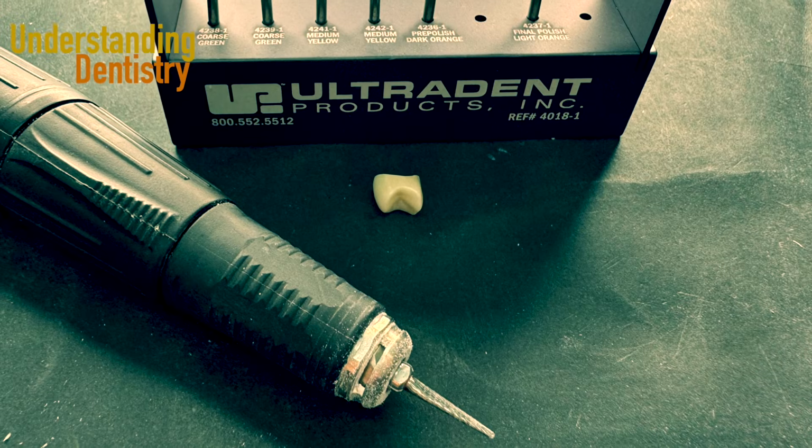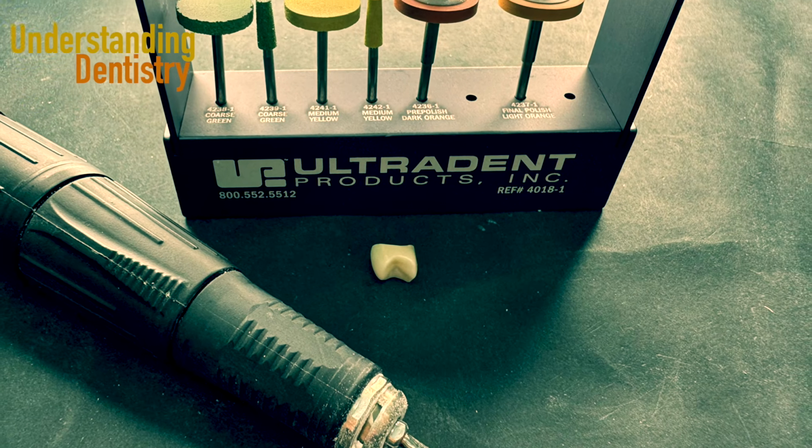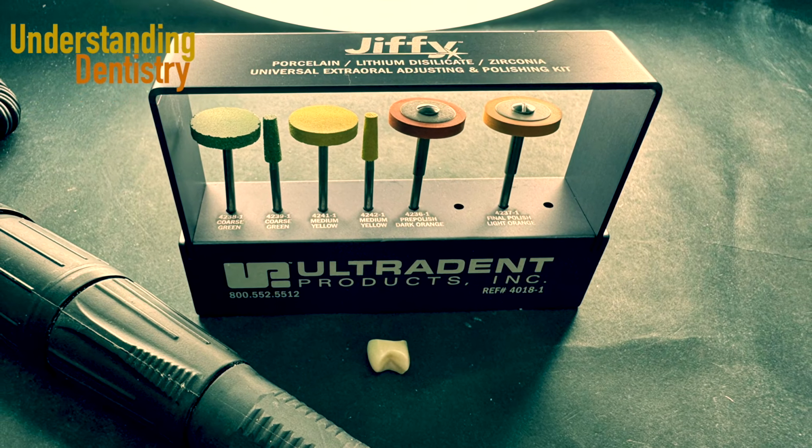And then at the end, when you send it to the laboratory and the crown comes, then you can even polish your crown. This is the polishing kit for crowns as well, okay, from Ultradent. Also a very nice polishing kit.